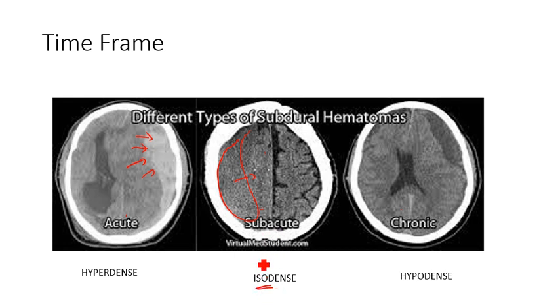And that's typically within 1 to 7 days, then around 7 to 14 days, then above 14 days. So you can kind of tell how old this bleed is. And finally, by the time it's chronic, it's completely hypodense. Hypodense, remember, means darkish, and so that's where you're seeing a hypodense lesion.